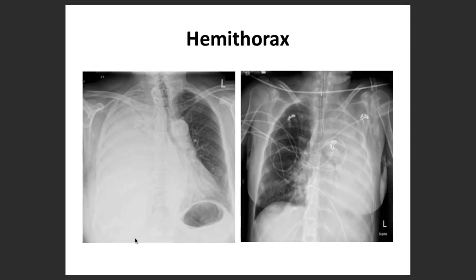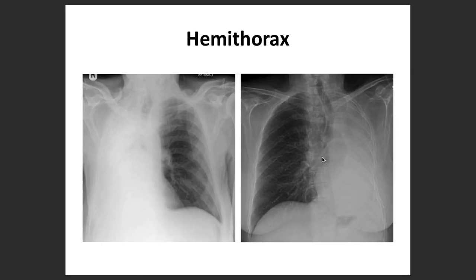However, it is going to be pulled towards the opacified side, for example, if you look over here in the last X-ray, if there is a lung collapse, a pneumonectomy, pulmonary hypoplasia, or pulmonary agenesis. Then you will be able to see this towards the opacified side.